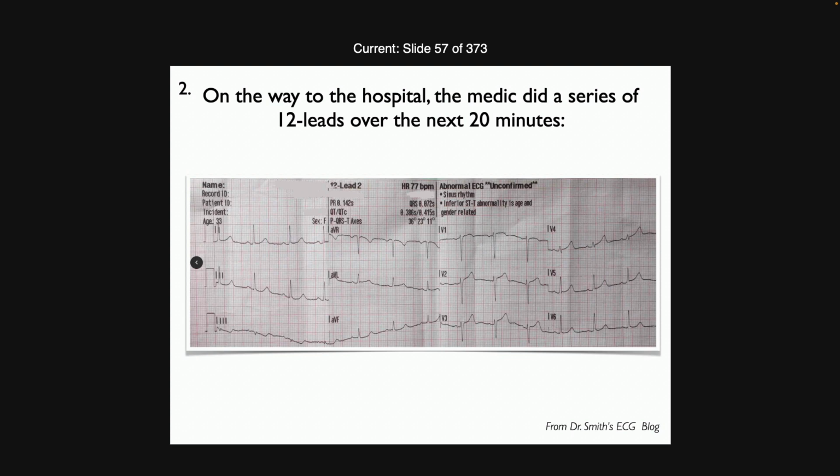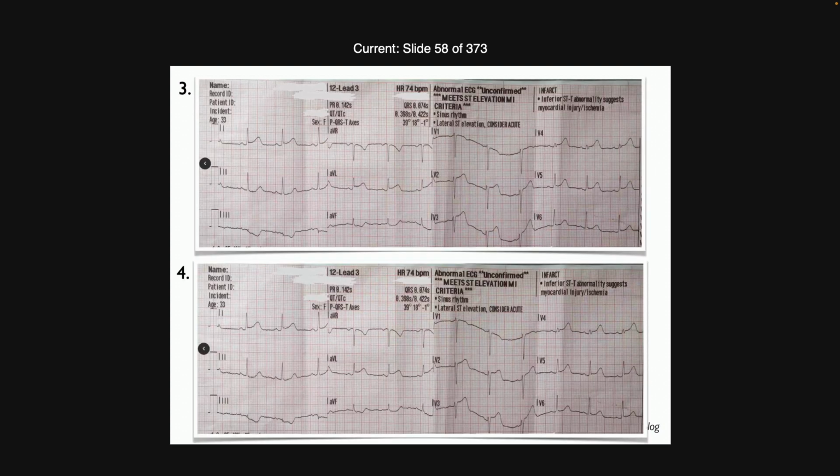So you can see how it's started to change. Now finally at this point the monitor is picking it up, and we've got reciprocal changes in the inferior leads and elevation in the high lateral, as well as stuff happening here.